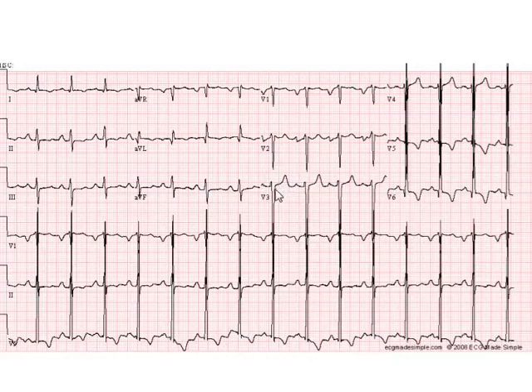Let's examine for ventricular hypertrophy. The R waves are quite tall in lead V5 and V6. The sum of the S wave in lead V1 and the R wave in lead V6 is well over 35 millimeters, which supports the diagnosis of left ventricular hypertrophy.